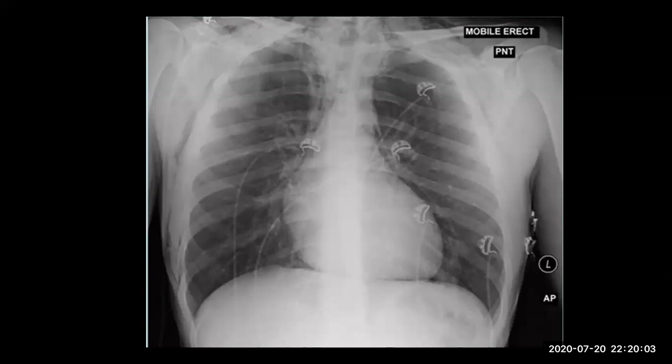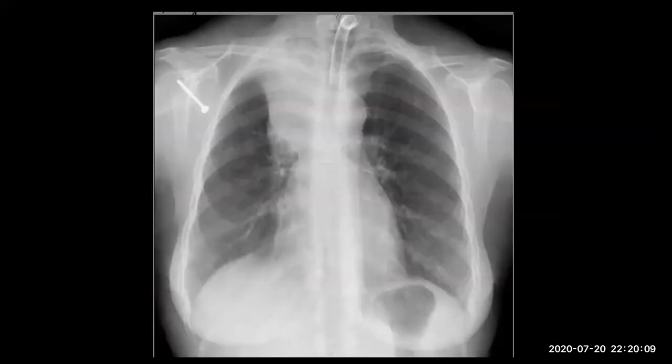So this is a trauma patient. For this case, we need a full description. We need first the spot diagnosis, and next the full description: the procedure, the findings, the differential diagnosis, and the most likely diagnosis. First, spot diagnosis. What is this?